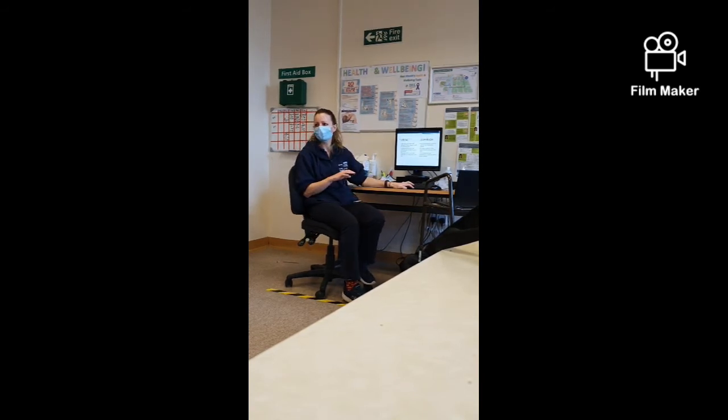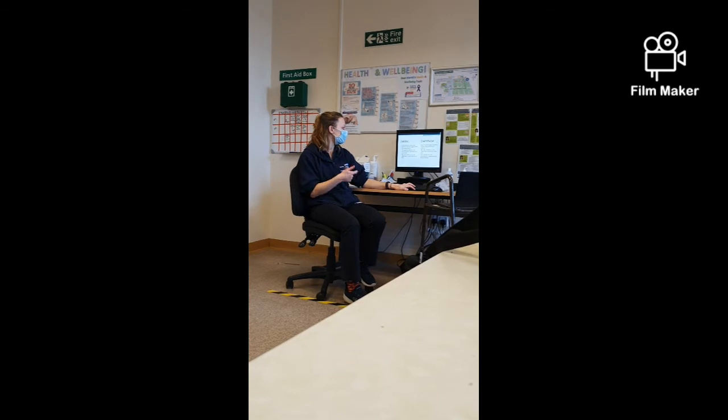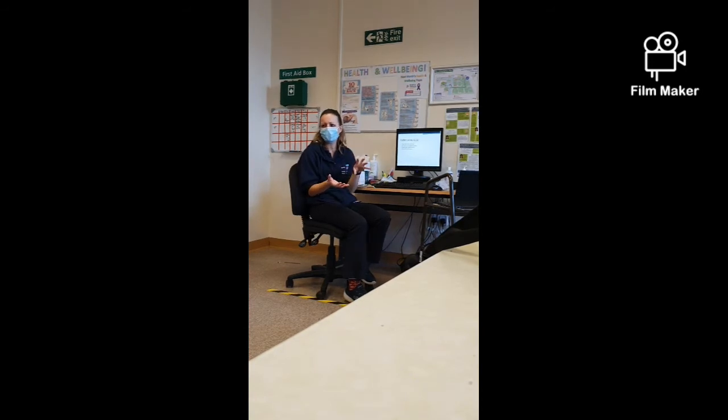Everyone happy with that? So we've got airways, we've got your breathing, we've got your cardiac, we've got your diaphragm, and then we've got E, which is everything else. So what might come under E? What might you have as everything else? What might we want to also look at?